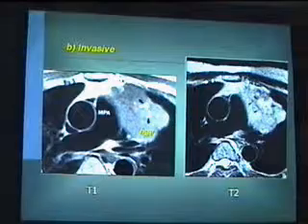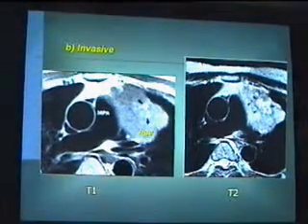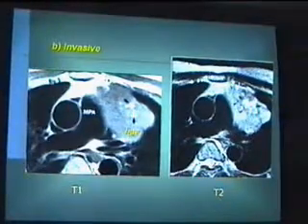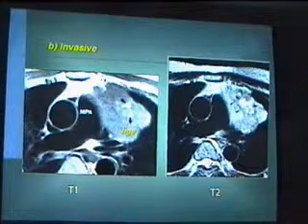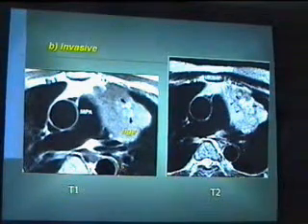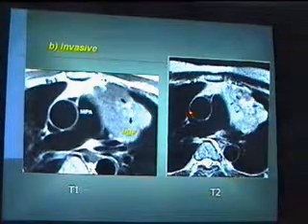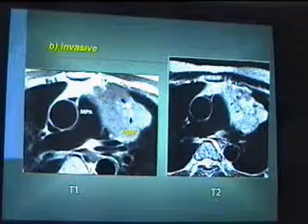And this is a T1 weighted image with areas of high signal intensity that appear still high on the T2 weighted images. Most likely this is subacute blood. فيها hemorrhage. Okay? Of course, this is the ascending, this is the descending aorta, and this is the inferior, this is the superior vena cava compressed here.